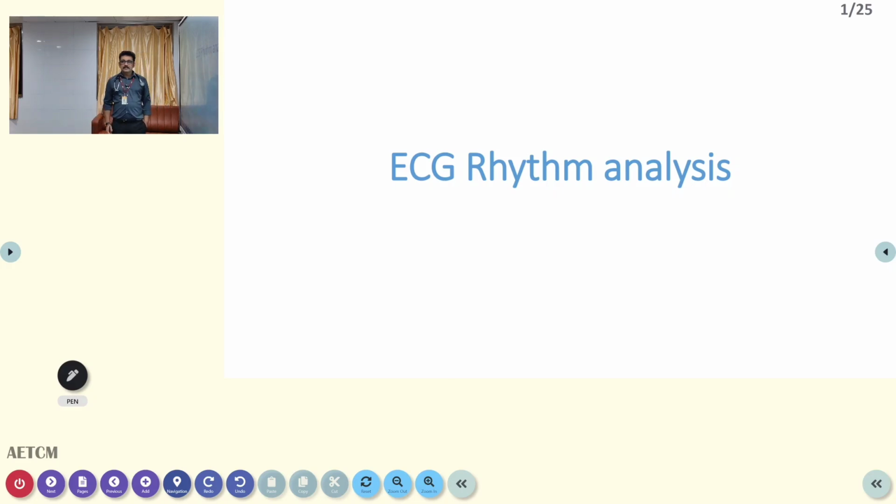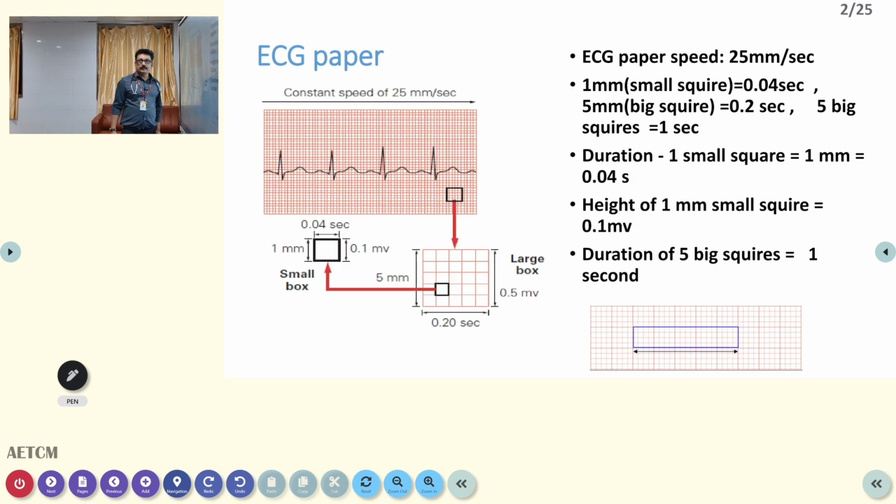Today, let us discuss ECG rhythm analysis. Last class, we saw some of the basics of ECG, how to take an ECG, how to read a normal ECG, all these things. Today, we'll talk about rhythm analysis. Now, this one was discussed in the last class.